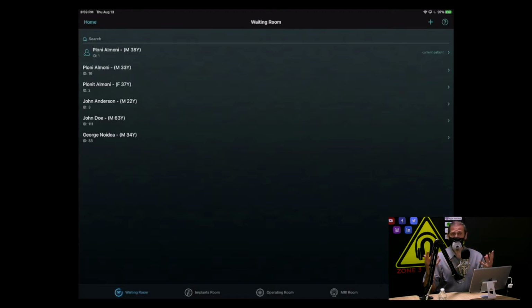The concept is that when the technologist walks in the morning, they turn on the scanner, and then they go to the waiting room to bring their first patient into the scanner. So the intent is to have them use the app before the patients get there. For example, you look at tomorrow's schedule. Let's see. Tomorrow I have Joe Smith. Joe Smith is 5'9" and is 187 pounds, and they have a piece of shrapnel in their right elbow. And he's here for a head MRI for headaches.